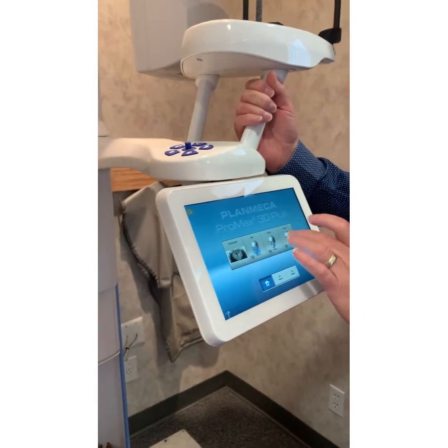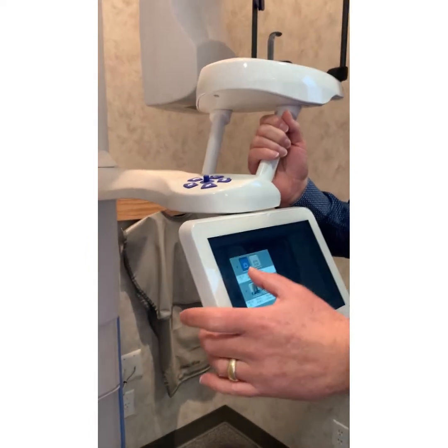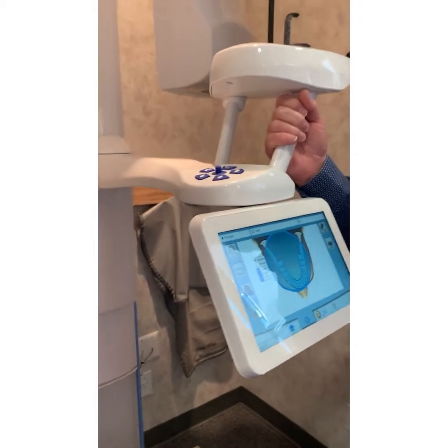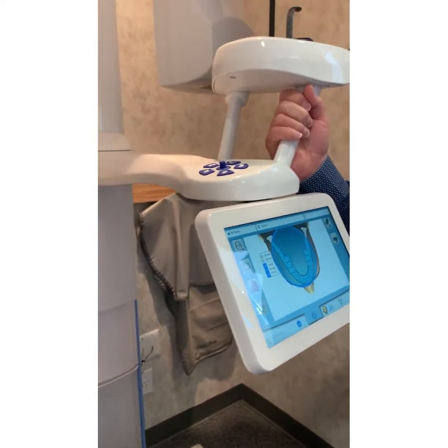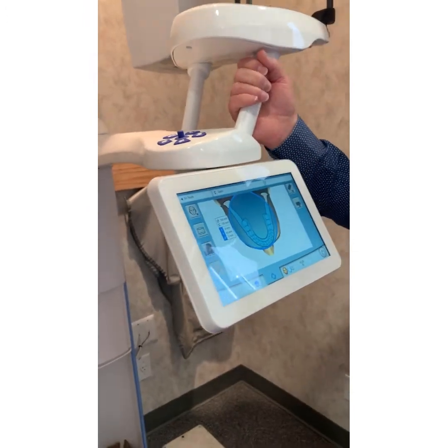So you're always going to want a 10 by 10 of. I'll tell you what I want. I'll say, give me a full lower jaw. Or I'll say, give me a lower right. Usually I'll ask for one jaw or the other. I'll say, give me an upper jaw, give me a lower jaw, or give me both. That's what I'm asking. I can just ask for endo, upper or lower or both.